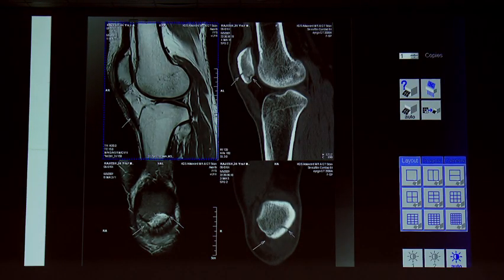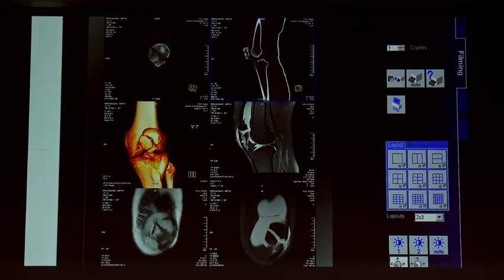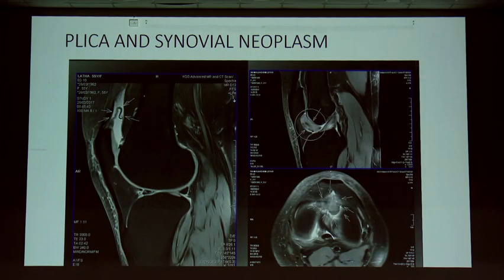Patellar sleeve fractures, when there is avulsion of the inferior pole, this is a classical avulsion fracture of the inferior pole of the patella, or a shattered patella like this, with multiple fractures. And you can see sometimes the patella can be fragmented into two pieces. One piece is left over here, another piece is left there. This is commonly seen when the MPFL is not able to rupture, it will totally avulse the entire portion of the patellar facet and it will come and stay here. This is very important because the surgical plan is different.